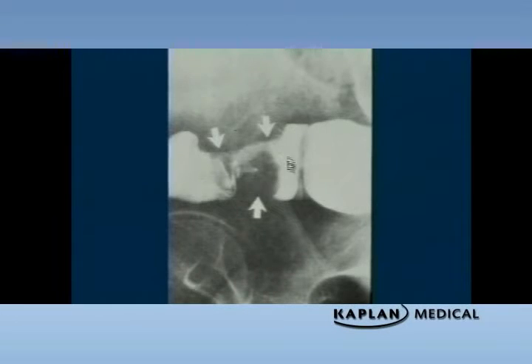Same thing here. Get a colectomy right away. Circumferential cancer here, pushing in the bowel. Barium, barium, and obstruction.